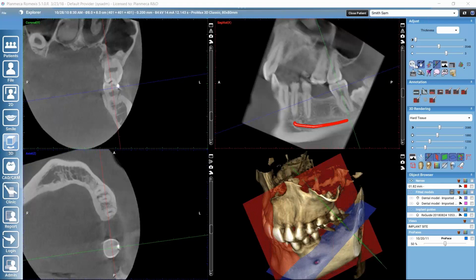So we don't always need to come here and activate and deactivate them with the mouse. And then just mentioning shortly this export view to other tabs. Because the other sub-modules, the tabs, don't necessarily have, for example, the coronal view, but if we would like to adjust the coronal orientation here and use that same orientation in other sub-modules, we can just simply click here.